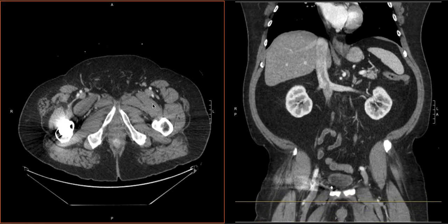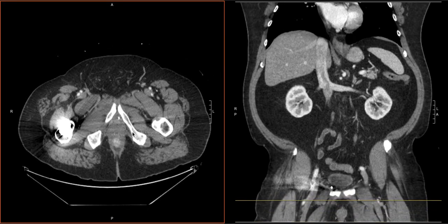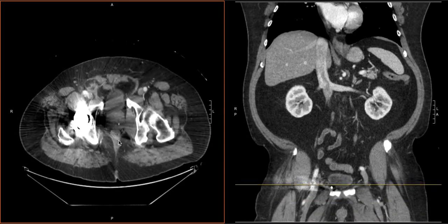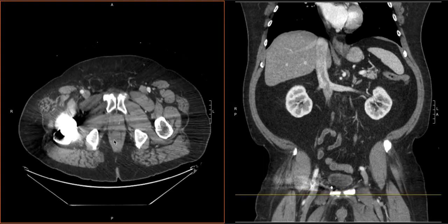We're going to stop here for this part of the search pattern, but now you're in a good position to take a look at the GI tract, and you can find the rectum here and start running the bowel.